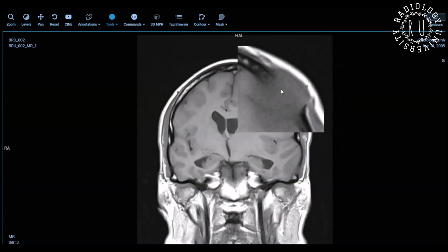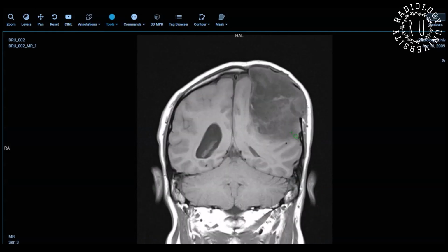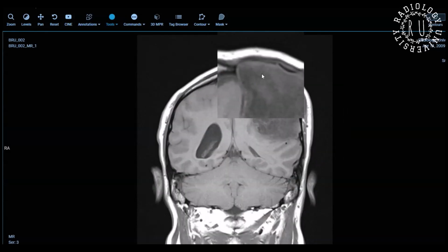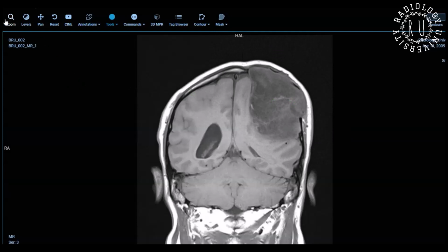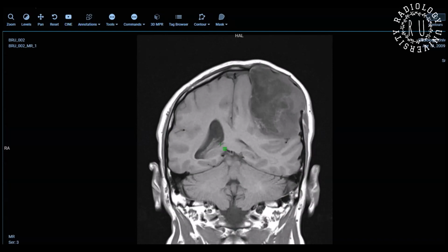I suspect that this lesion may represent a frank deposit of Langerhans cell histiocytosis, with differential consideration of skull metastasis or a less likely atypical meningioma, such as hemangiopericytoma. I would like to take this case further by urgently informing the referring clinician about the findings and advice for further systemic imaging.